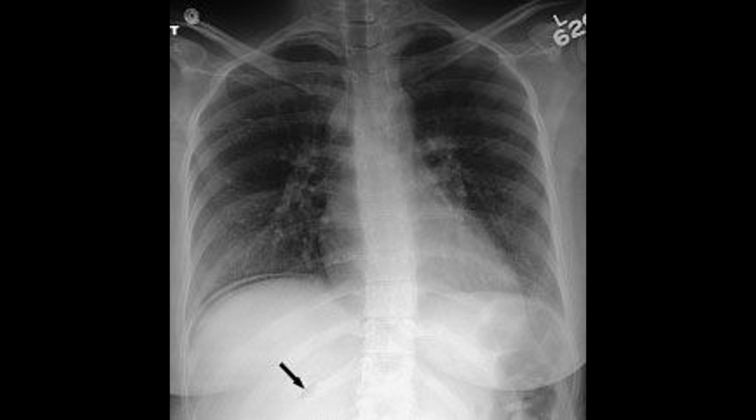The main differential diagnosis for a curvilinear lucency beneath the right hemidiaphragm includes a subpulmonic pneumothorax and free intraperitoneal gas. The key to distinguishing between them is the patient's position. On an upright chest radiograph, gas in this location is almost always intraperitoneal, whereas on a supine radiograph, it could be either subpulmonic, pleural air, or free peritoneal air.